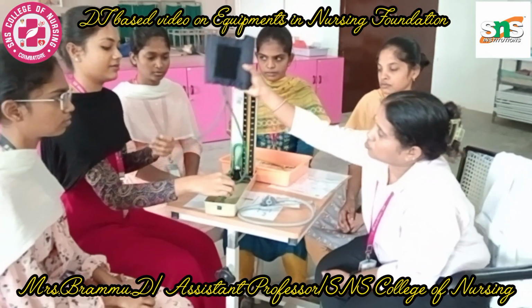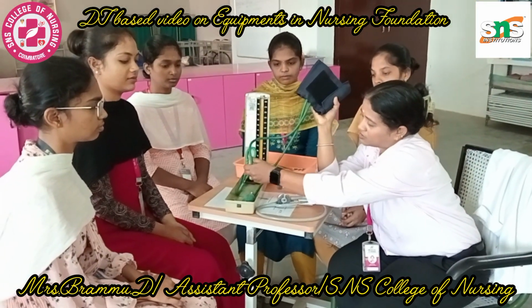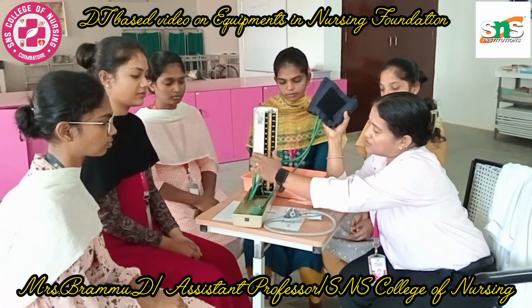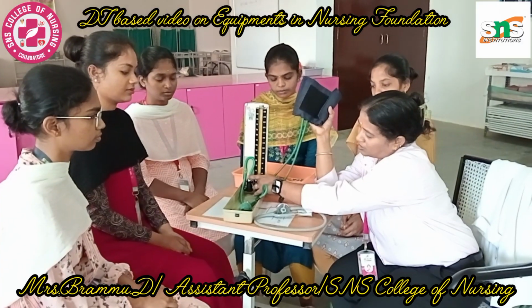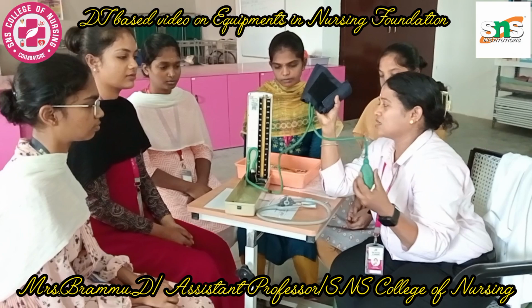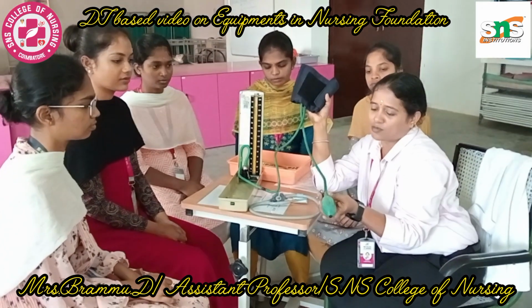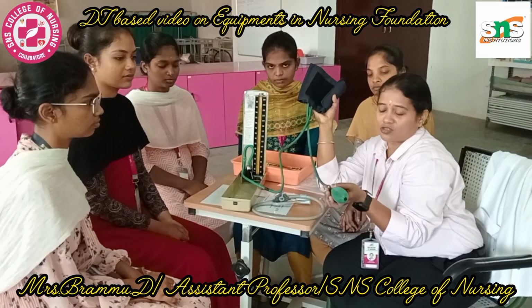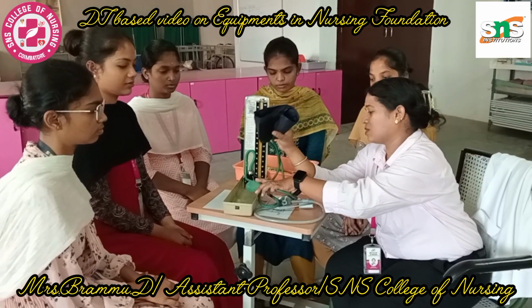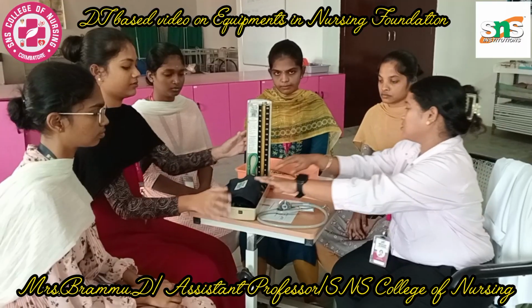So here you have two more tubings. One tubing will be connected to the mercury tank, and during inflation this enables the reservoir to fill the glass tube with mercury. The other tubing is for the nurse to inflate the bladder, and you have the adjustable screw. When you hear the systole and diastole, we will be adjusting and finding the systolic blood pressure as well as the diastolic blood pressure. So that is all about the parts of the sphygmomanometer.